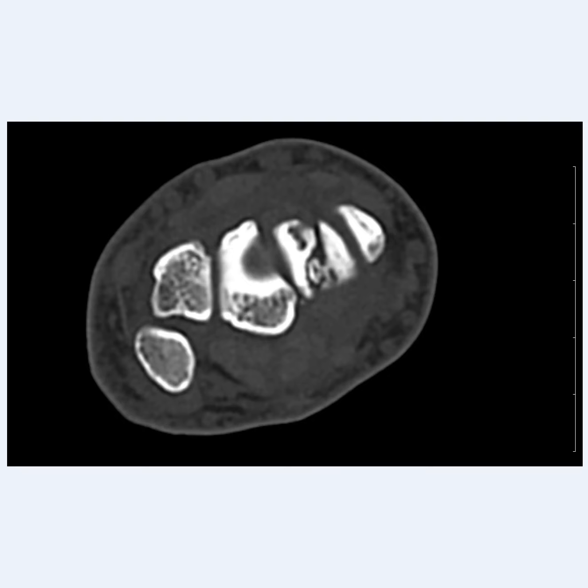Additionally, this is a second axial view of the wrist. This just shows a different cut through the fracture so that we can see kind of how irregular the cut is. And again, we can see some brightness of this side of the scaphoid compared to this side, which may represent the avascular necrosis.